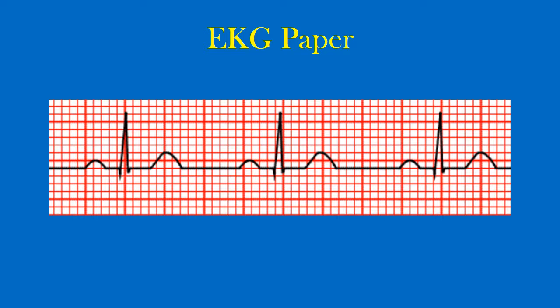This grid system is made up of two types of lines, one that is bold and the other that is not. Here we can see those lines. Here's the darker bolded line, and note how these form boxes, and here's the thinner lines that are not bold in between.